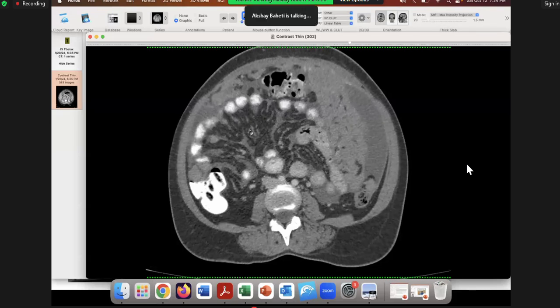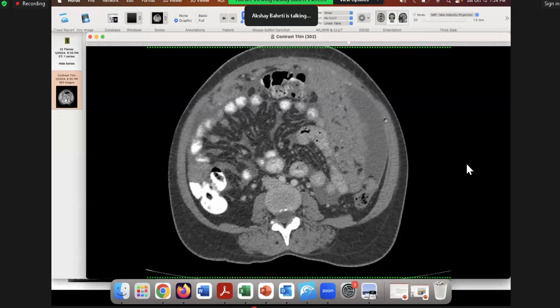All right. Now, what do you think? Is this normal or abnormal? See, with a lot of fluid, you will see some fluid in the mesentery also. If there's a lot of ascites, you will see some fluid, some fat stranding in the mesentery. It's abnormal, sir. It is difficult to be sure what's happening often. But in this case, I think you can give a confident diagnosis.